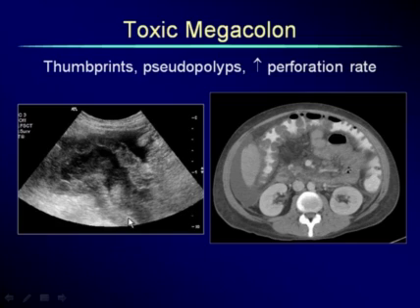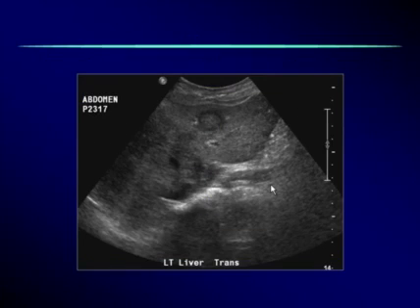This patient, as I recall, had a right lower quadrant renal transplant and was having pain. We looked at the transplant and adjacent to it found this extremely abnormal loop of colon. She ended up having CT, which showed this toxic megacolon, showed the extent much better.